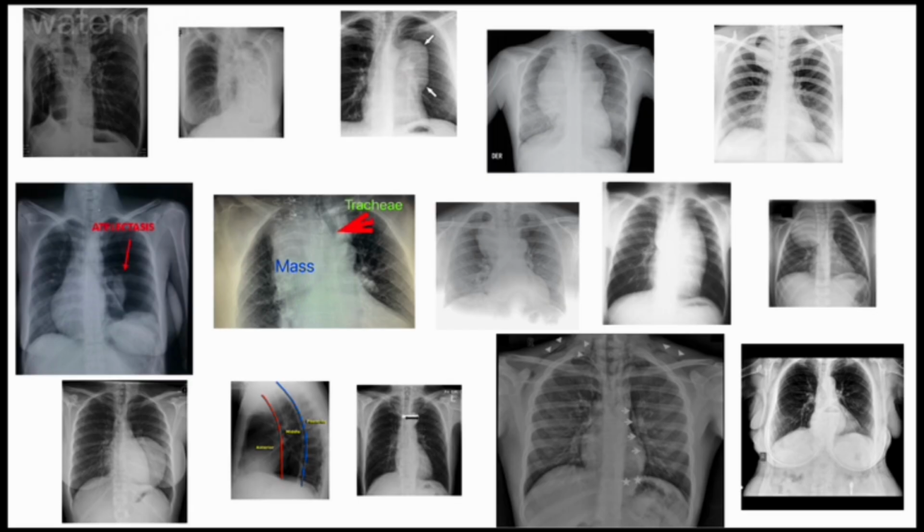On the lower row, again, we have lesions which can be due to a collapsed lung. They may simulate lung atelectasis, or may simulate a mediastinal tumor. But clearly here also, we look at how it affects the trachea, and this may tell us about the lesion. So these are some of the examples: positive cervicothoracic sign, positive thoracoabdominal sign, and of course we also see a little bit of extension there.